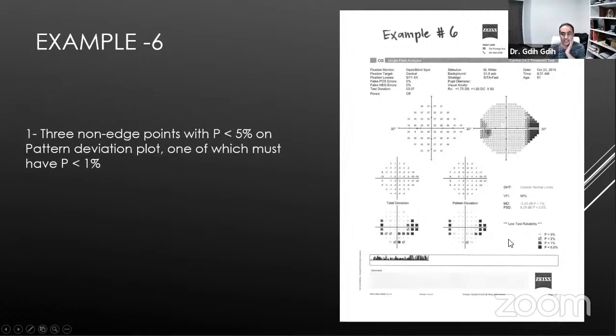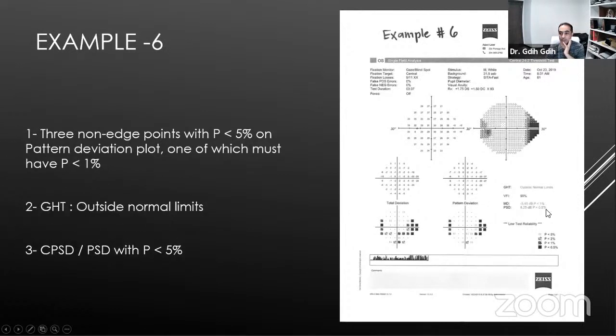So for the 3 non-edge points, do we have them? Yes, we do. Is it in the area common for glaucoma? Yes, it's in the nasal aspect. Is it outside normal limits, GHT? Yes, it is. And PSD less than 0.5%? Yes.